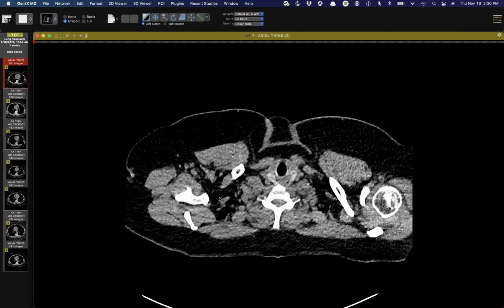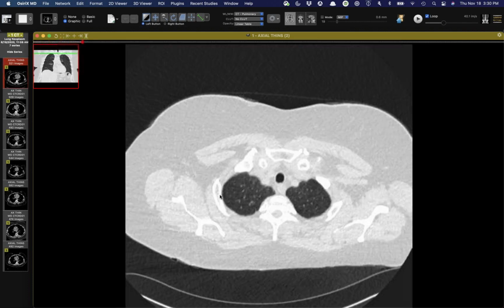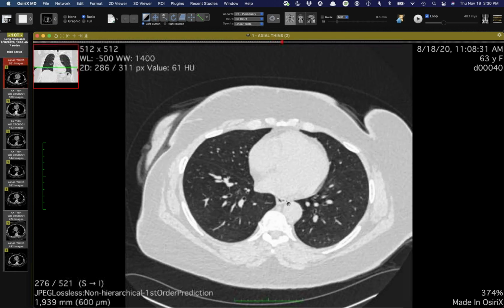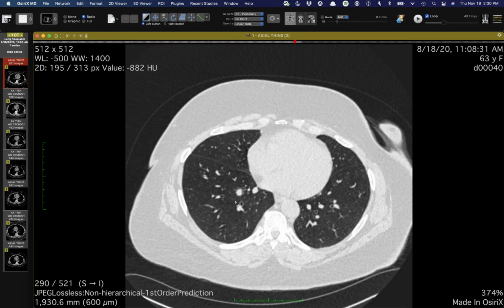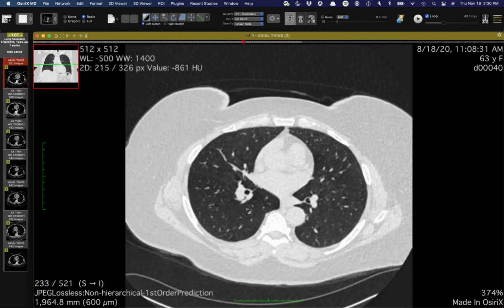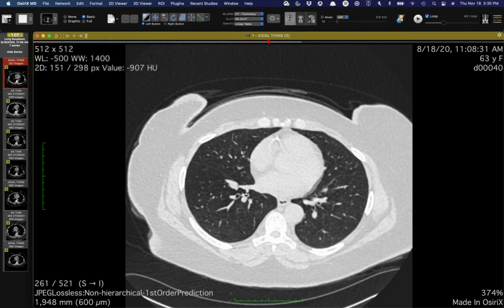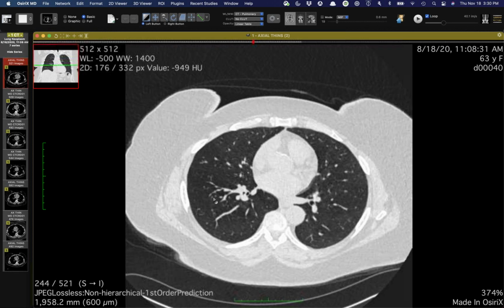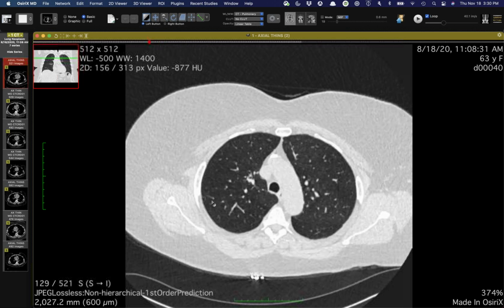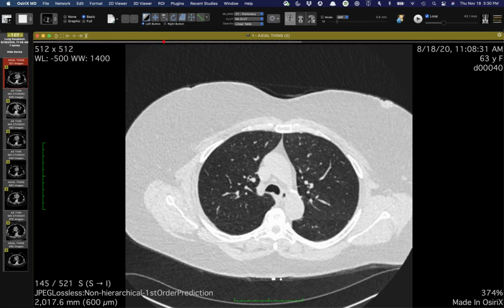And then I'm just going to show this one. This is a perplexing case. This is a patient who last summer had a biopsy-proved squamous cell carcinoma of the lung. Lungs otherwise look okay. There's a few little additional nodules in the right lower lobe next to that, and not much to make of that.